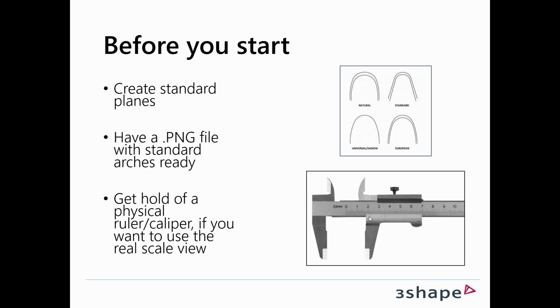But before you start, you should create the standard planes, and we have a separate video on that. You should have a PNG file ready with the standard arches. You will see that later on. And you should also get hold of a physical ruler or caliper if you want to use the real scale view. But let's go into Ortho Analyzer and see how the dental arch analysis works.